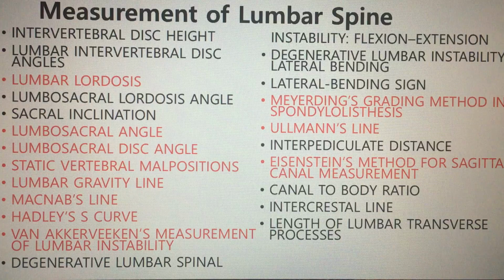There are many alignments and measurements of the lumbar spine. Today, let's see Meyerding's grading method in spondylolisthesis.